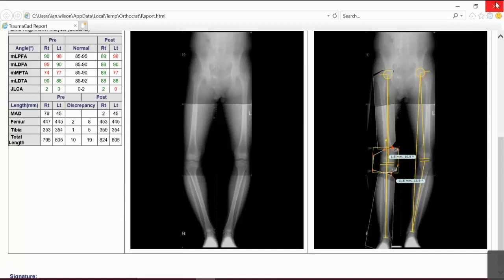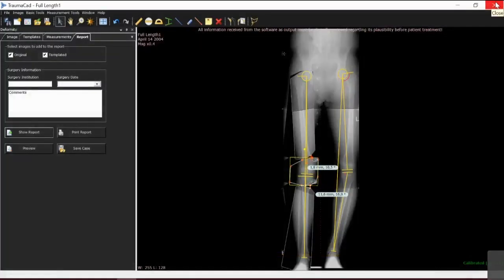Okay, right, so we've finished. We've gone through once again a hip case, a knee case, and a deformity case. So now we'll open up the floor for any questions and answers.